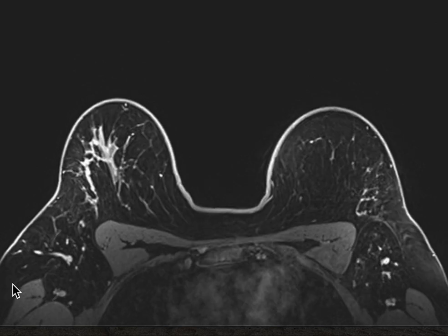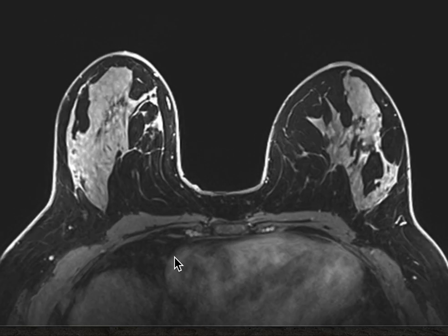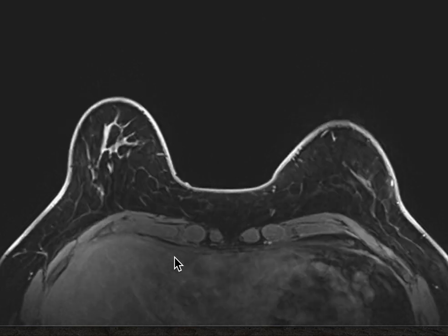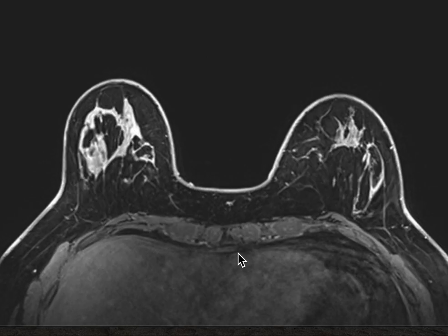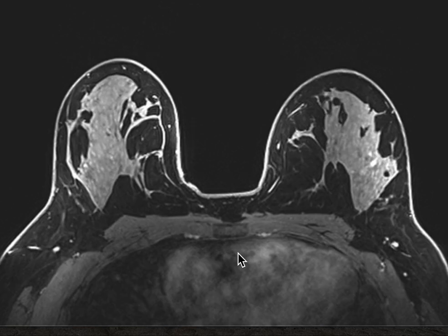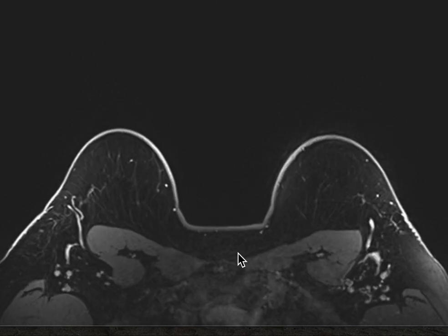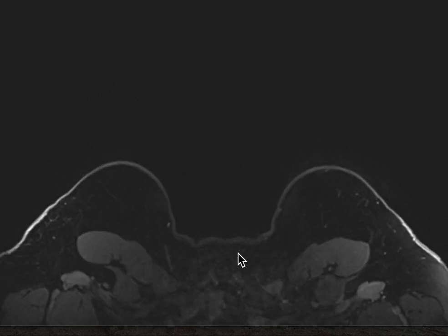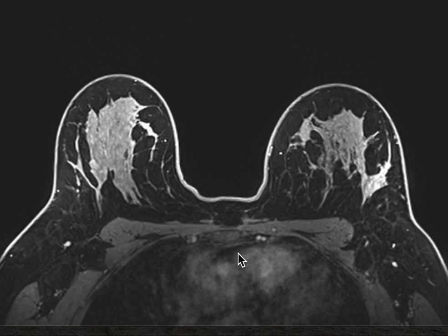Then I go back to the non-breast stuff and look through from superior to inferior, down on one side and then up the other side, to make sure I'm not seeing anything. And it's really good to read even a lot of normals, so your brain is taking in normal. Some people complain, oh my gosh, I had to read all these normals, it's so boring, there's no pathology. Once you get your eyes on a lot of normals, abnormal will just pop out at you, and your eyes will be attracted to it.